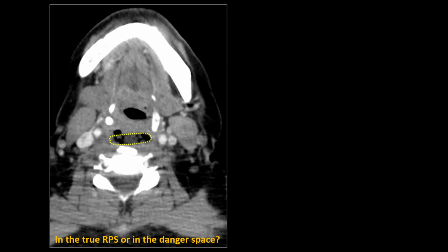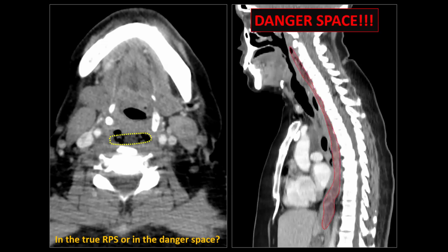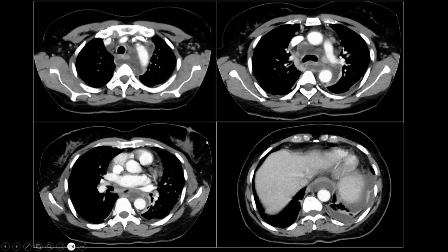So that's why it is important to look at your sagittal images to look how extensive the abscess or the collection truly is. And in this patient, we saw it extending all the way down into the chest, all the way further down up until the upper abdomen. So this proves that this retropharyngeal collection was located in the danger space and caused a secondary mediastinitis.